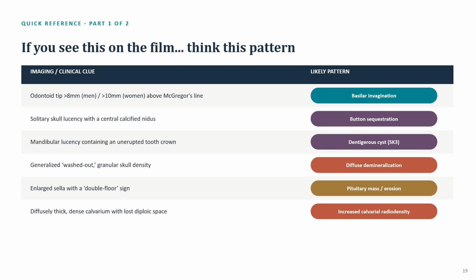And if the skull looks unusually thick or white on imaging, that might point us to increased calvarial radiodensity. So again, these are just some signs or some clues. We're not trying to diagnose, but of course, in our job, we're going to see some of these things.